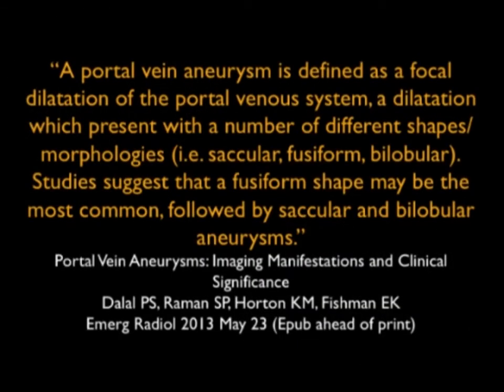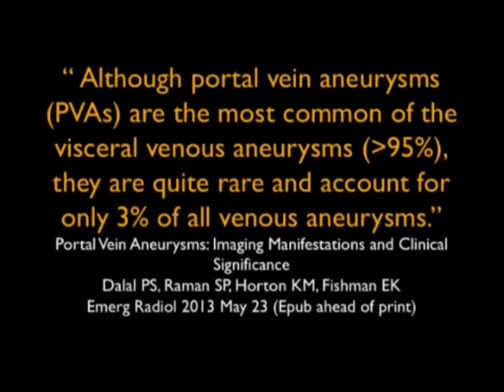We did publish an article about this a couple years back. Portal vein aneurysm is defined as a focal dilatation of the portal venous system, a dilatation which presents with a number of different shapes, morphologies, with fusiform probably being the most common. We also noted that although portal vein aneurysms are the most common of the visceral venous aneurysms, they're quite rare and account for only 3% of venous aneurysms. So we've probably seen about a half a dozen cases.